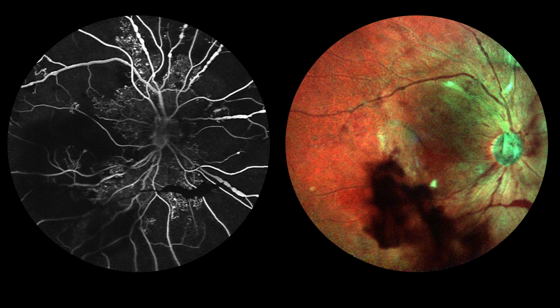Now this is another case where again you see this black area, but when you look at the fundus photo, you can make out that there is pre-retinal hemorrhage, which is basically causing this black area. So it is blocked fluorescence. Also there is some vitreous hemorrhage which is causing some of the black areas here, but there is no blood here, and yet you see these black areas. So probably this is where the blood is not flowing normally. So these are areas of capillary non-perfusion.